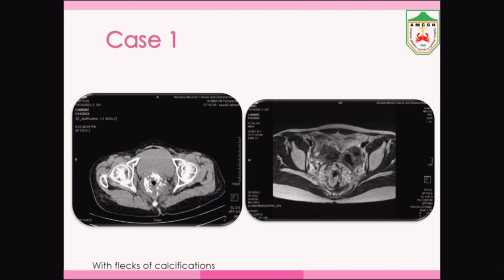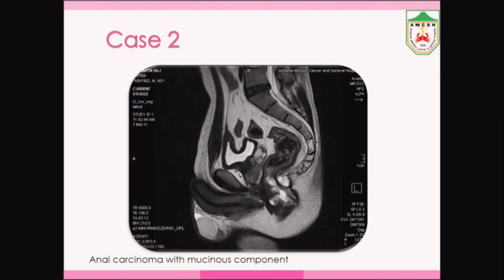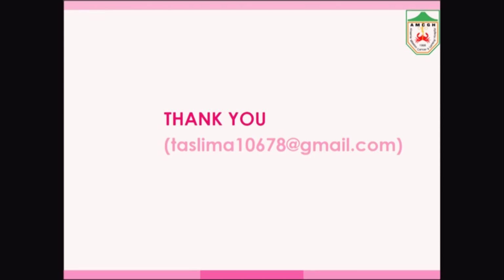This is one of our cases showing flecks of calcification in a mucinous variety. This is also a case of anal cancer with mucinous component. So thank you. This is the staging system.